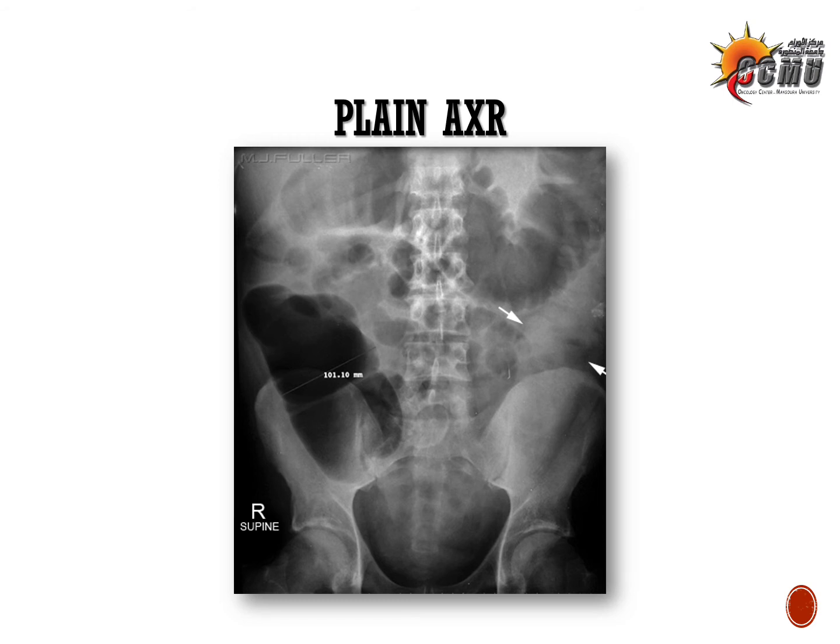So this denotes that the obstruction is distal to this dilated segment. Actually, the transverse colon is also dilated, as you may follow the gaseous shadow there, and maybe on the left side, around the arrows, there'll be some shadow of feces or mass. So there is obstruction on the left side, causing dilatation of the transverse colon and of the cecum as well.